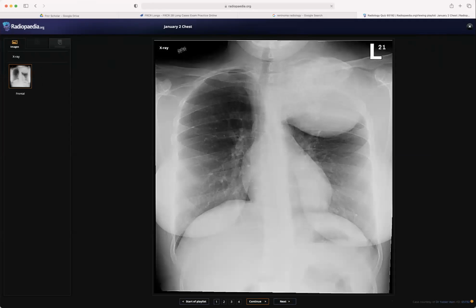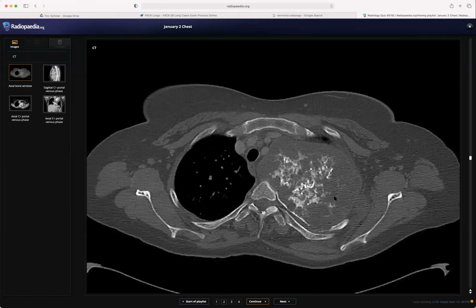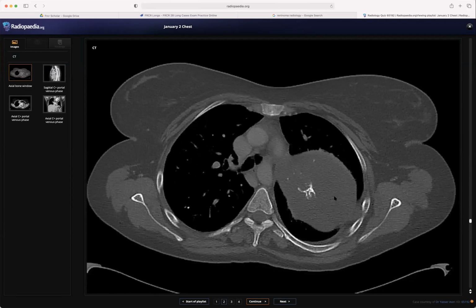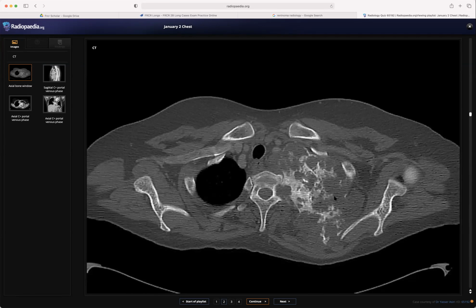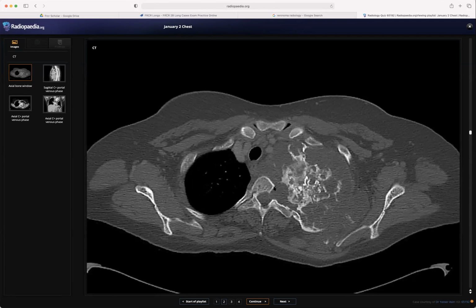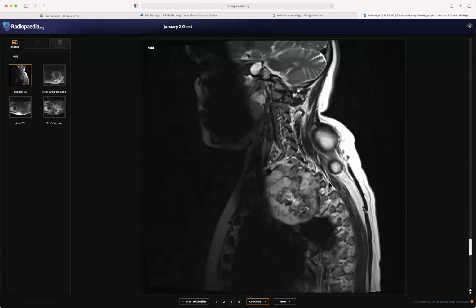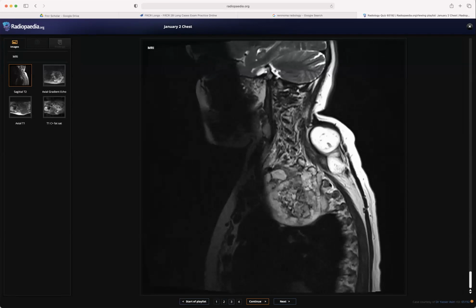And the first one, you described it perfectly well. This is a chondrosarcoma because of the calcifications. And this is why the patient presented. So this was the CT of the patient. Of course, we have to do a CT just to confirm the findings and confirm the extension. And here we also have an extension into the intervertebral foramen. That's why the patient also had an MRI study as well. But you picked it up very well on the chest X-ray.